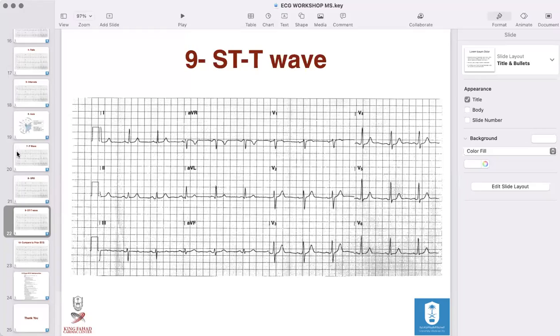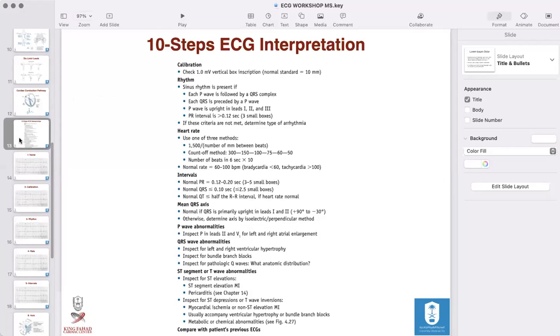And then you're gonna look at the T wave, okay? And that's where you're gonna look if the T wave is peaked, if the T wave is flipped, which is called T wave inversion, any changes that happen in the T wave. There's a long differential. It can be just strain from hypertrophy of the ventricle. It can be from metabolic causes, it can be from medication. There's a lot of differential.